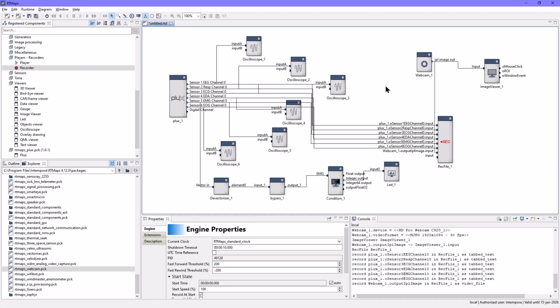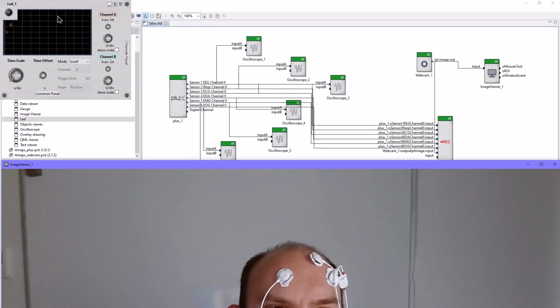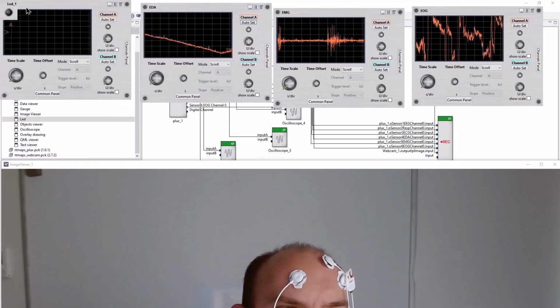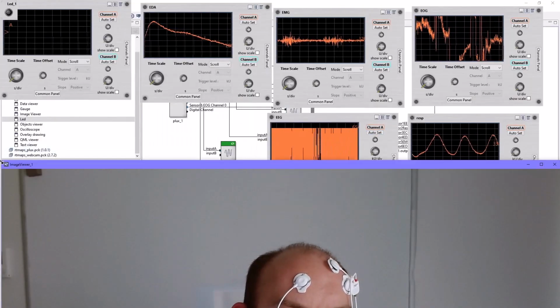That's it. Our RTMaps application with Biosignalsplux sensors has been designed and configured in just 3 minutes. Now we can start the application and record the streams. First, let's arrange the windows to our liking. Then, click on the oscilloscope's auto set buttons to adjust the plot window to fit the data ranges.